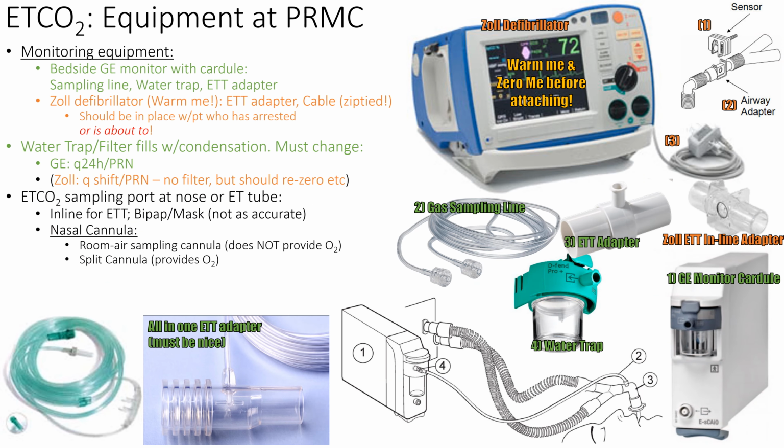Okay. So equipment we have: we have our bedside GE monitor. It can do it. All you have to do is plug in this little module right here. I'm going to pass this along. Then you have to get a water trap. You want to pass this along.